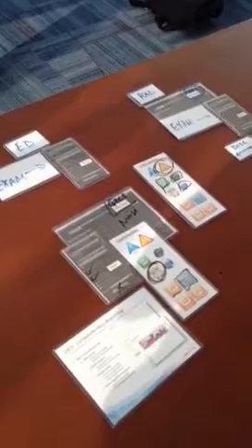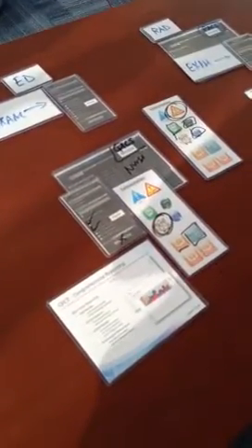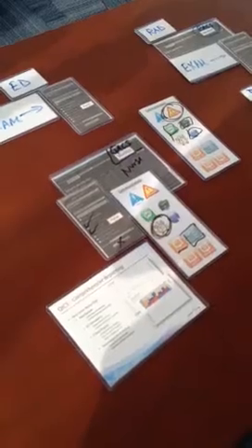As we're collecting all this information, we can create reports that document and measure things such as how often are there discrepancies, what type of discrepancies, how quickly are they communicated, how quickly are they resolved, how quickly is the loop closed.